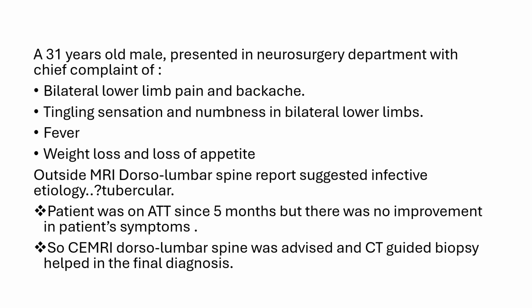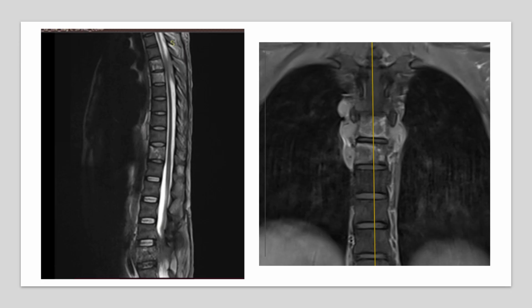And so contrast enhanced MRI was advised, and CT guided biopsy ultimately helped in the diagnosis. On the MRI, in the T1 weighted image and on this T2 weighted image, we can see abnormal hyperintensities at multiple vertebral levels, and also some mass in the epidural space.